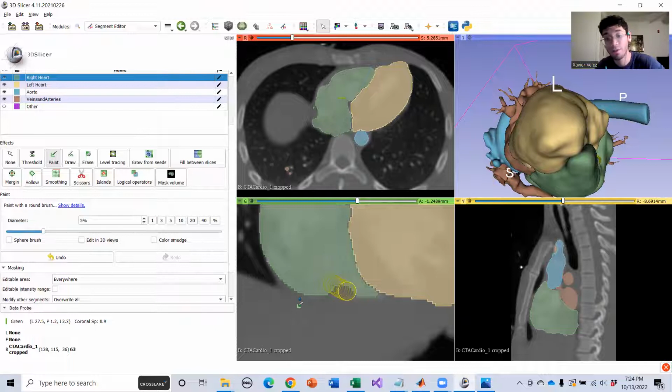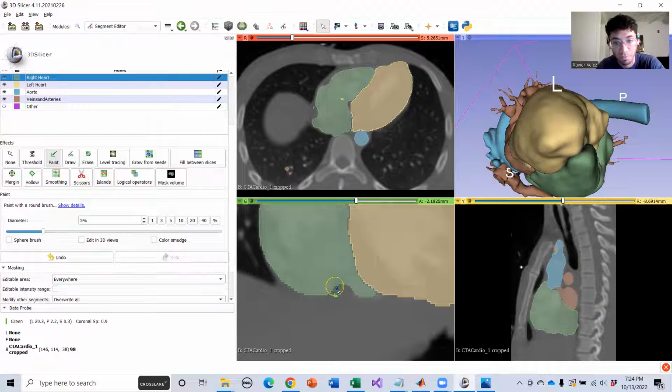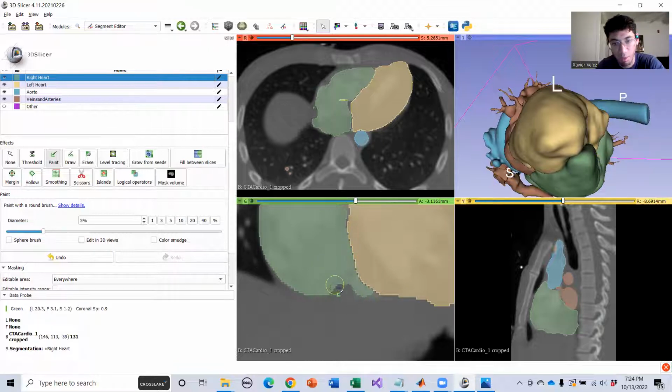And if you're doing something that doesn't need a lot of precision, you could have just gone heavier on that last smoothing step and called it a day. It really depends on your application. But if you need this to be more precise, things like this help.